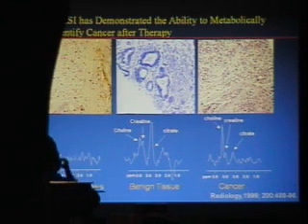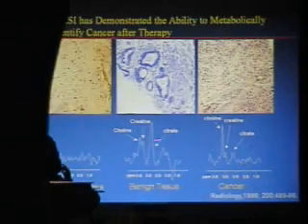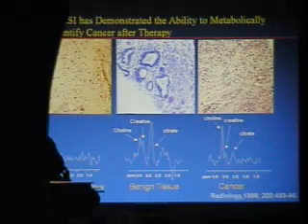And you can see clearly there's a big difference between cancer, benign tissue, and dead tissue. So dead tissue is basically flatline. There's no metabolic activity going on in these voxels. This is the pathology correlate. The normal looks like this. The normal prostate has lots of citrate in it, so we have a nice big citrate peak. We have a relatively small choline peak.